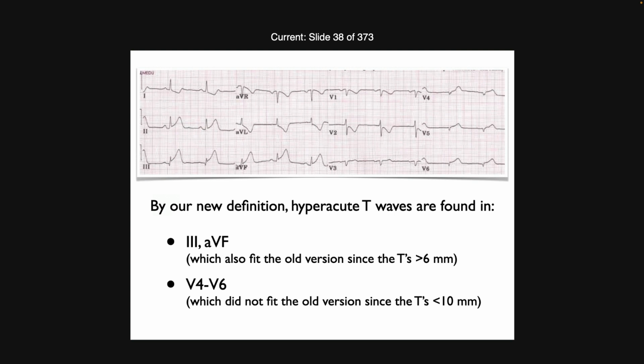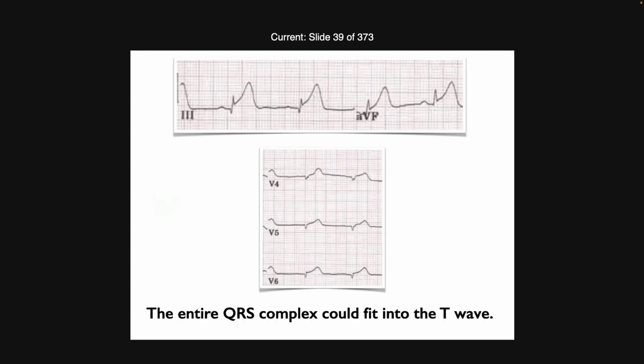I think I have it blown up. Here we go. So this isn't enough, there's a little bit of ST elevation here, but not so much here. But these are almost certainly hyperacute T's, meaning it's coming. Meaning if you did a 12 lead in, say, 10, 15 minutes, that ST elevation would probably have spread into these leads. Okay, so that's the significance.